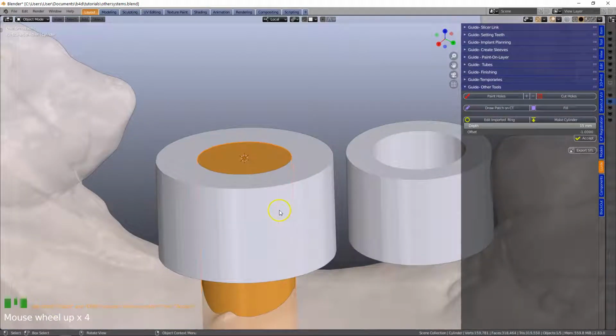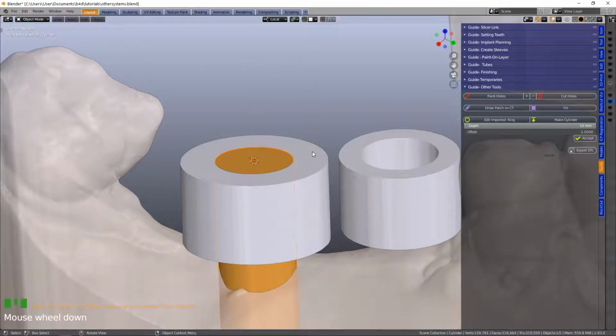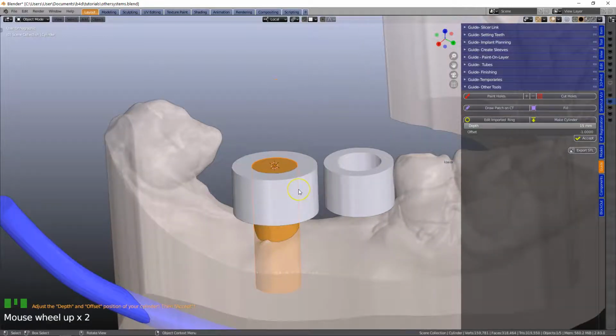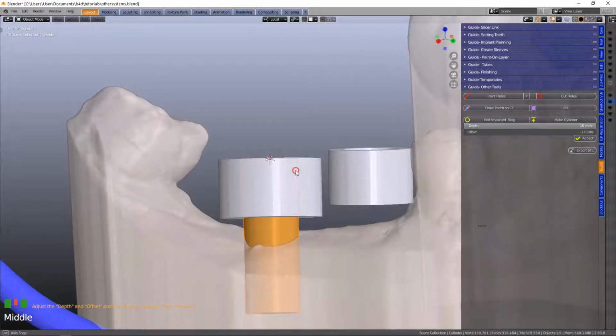Now this cylinder may be extracted towards the top this way or downwards, so this depends whether you're working on the top or bottom model. But in order to change that, just change this from a -1 to +1 or vice versa. So here I'm choosing -1 because it is in fact the correct direction.